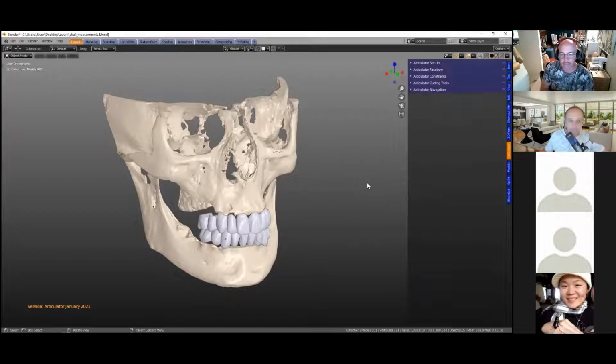So for those of you that don't know how this works, this is just a quick demonstration. We've taken the human skull as our example, and not so much the old mechanical devices that open the top of the jaw. We've decided rather to open the mandible instead. And it seems reasonable this way, because if we do import a CT scan, we don't want the skull to bop up and down like that.